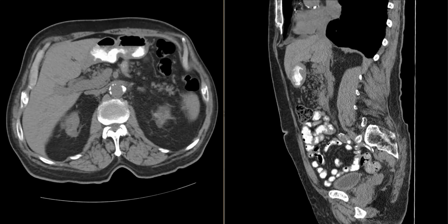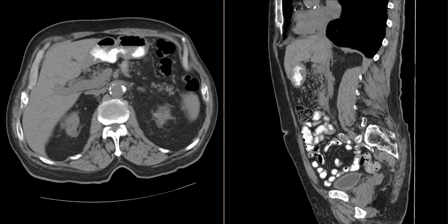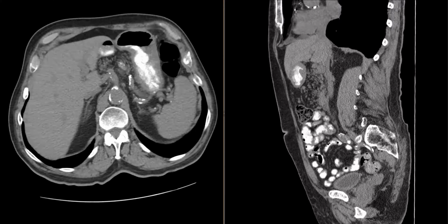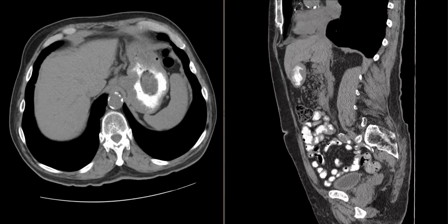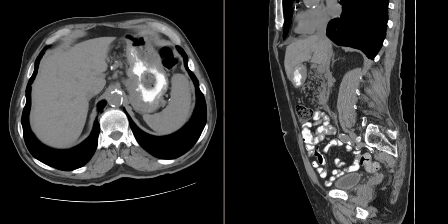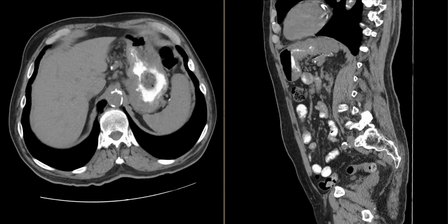And then there's a bunch of hyperdense lesions in the kidneys bilaterally. Yeah, the kidneys were just, I think, proteinaceous or hemorrhagic cysts, but some of the stuff in the stomach's catching your eye, and it did me too. Given the history, I was like, this could just be ingested material, but given the patient's weight loss, consider endoscopy or fluoroscopic upper GI. Sorry, can you scroll to the sagittal to see if it communicates with the wall?